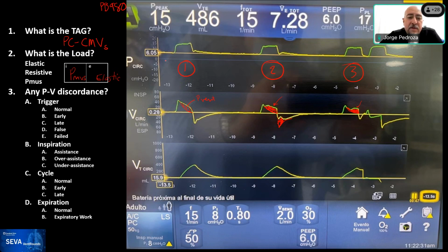Well, this ventilator doesn't show it like the new ones do, like Hamilton or Servo. If you see in the upper left corner, there's an A, and in this case, it's not necessarily related to what we do in the usual tag, since it can say three different things.